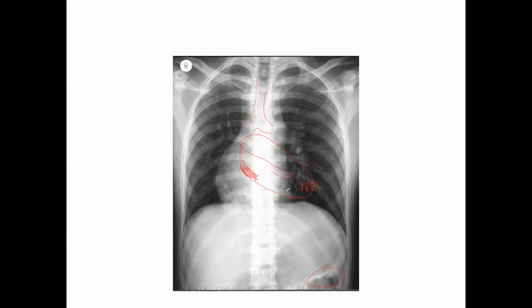But as you can see, let me pull out the eraser. Take care of those items. We'll go back. So now you can see that this heart kind of points the opposite direction. So this, aside from that, would look like a relatively normal chest x-ray, we have the hilar region and stuff here that can be seen.